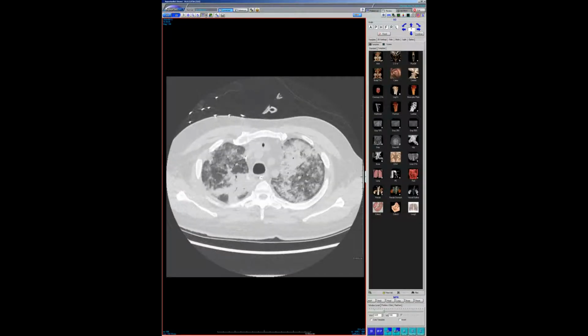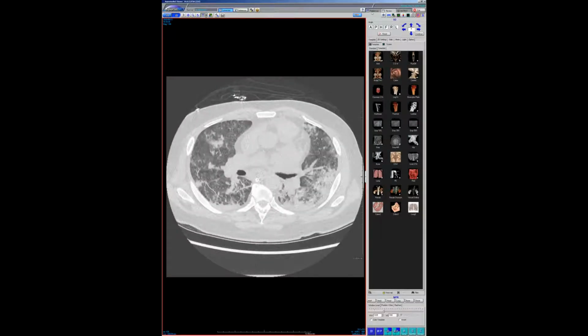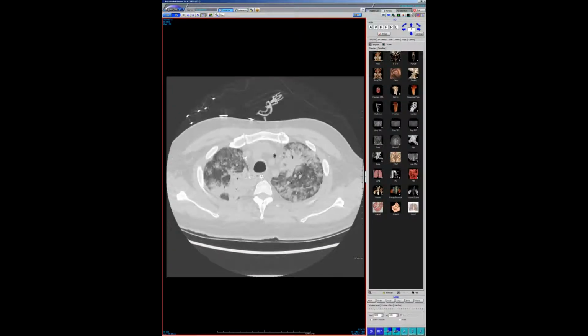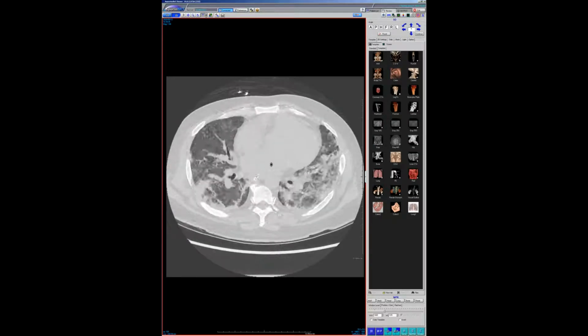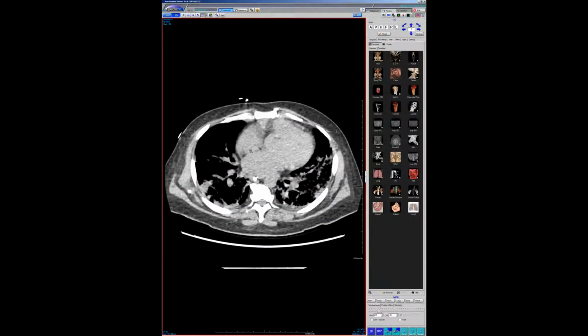Makes you wonder, was there no superimposed infection, like a mycobacterial or nocardia or something that patients with lipoid pneumonia are predisposed to? They did a full infectious workup for what that's worth, and everything came back negative. Yeah, I don't know. To me, it's a little suspect as well. I don't know what to say. Yeah, it looks like there's more superimposed lung injury.